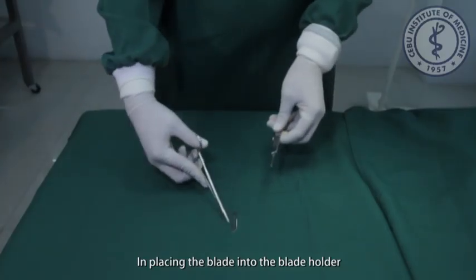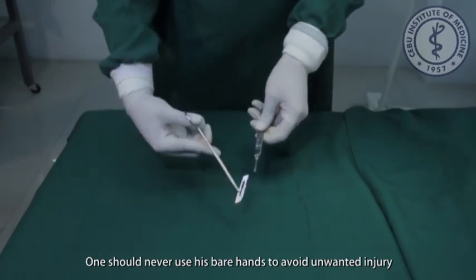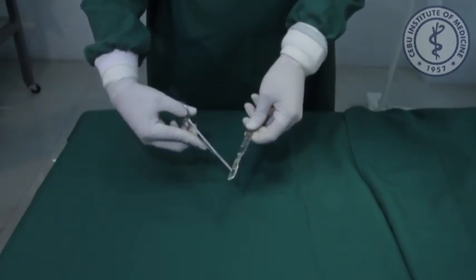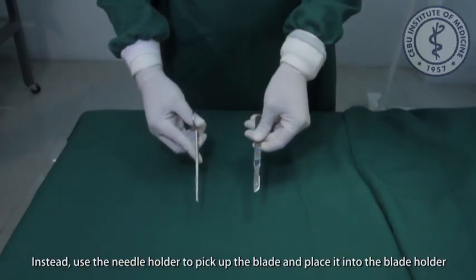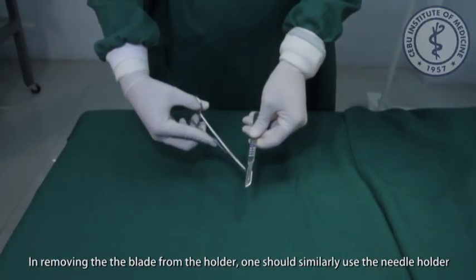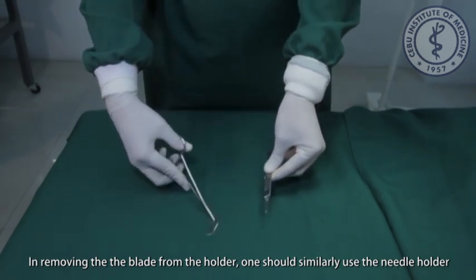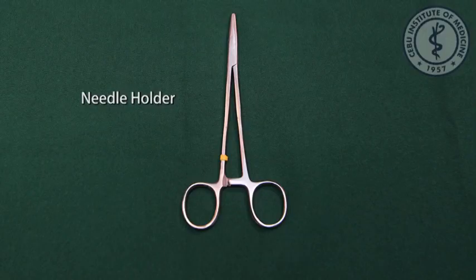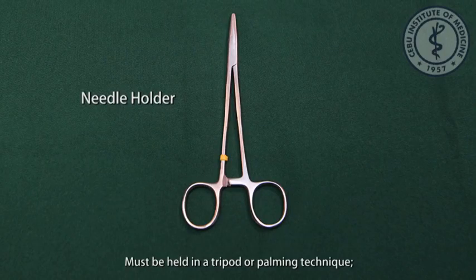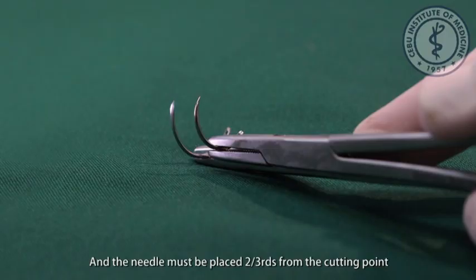In placing the blade into the blade holder, one should never use his bare hands to avoid unwanted injury. Instead, use the needle holder to pick up the blade and place it into the blade holder. In removing the blade from the holder, one should similarly use the needle holder. The needle holder must be held in a tripod or palming technique, and the needle must be placed 2/3 from the cutting point.